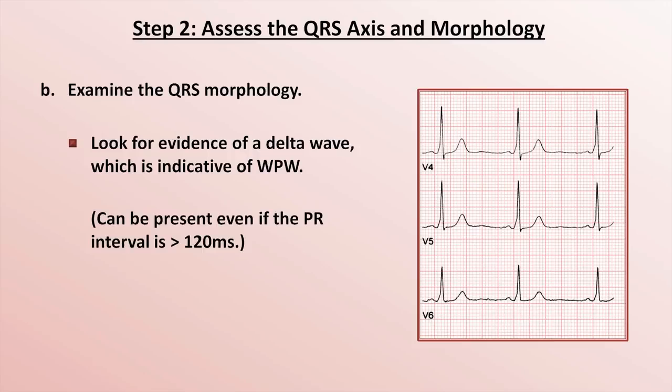An accessory pathway is an abnormal tract of conductive myocardium that connects the atria to the ventricles without needing to pass through the AV node. Thus, these are also sometimes referred to as bypass tracts. On EKG, the presence of delta waves, QRS widening, and a short PR interval is collectively known as the Wolff-Parkinson-White pattern, and when it's associated with paroxysmal tachycardias, it's called the Wolff-Parkinson-White syndrome.